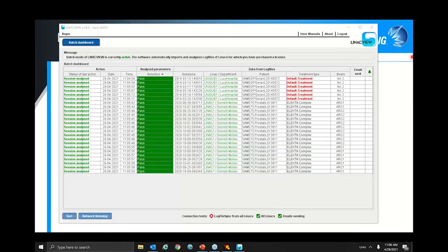So this is completely passing. So I'll pick another session to show you some failures. All 9 daily sessions for each arc show pass rates.